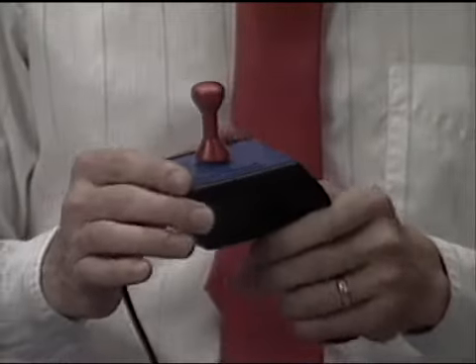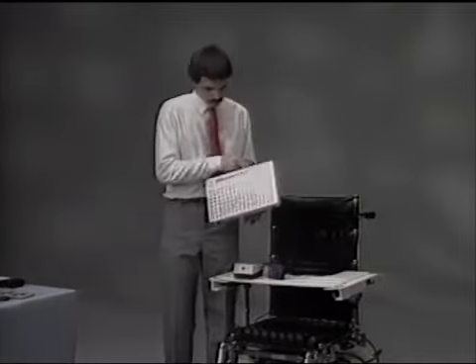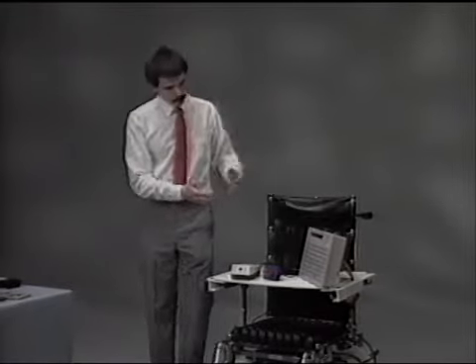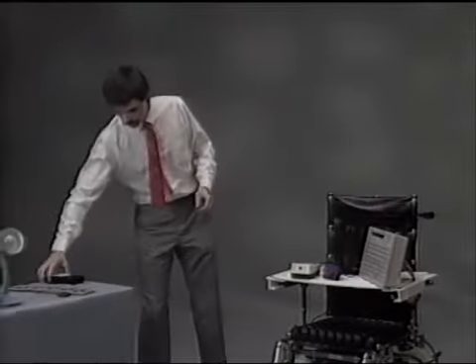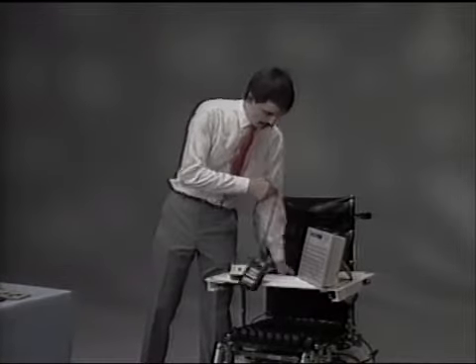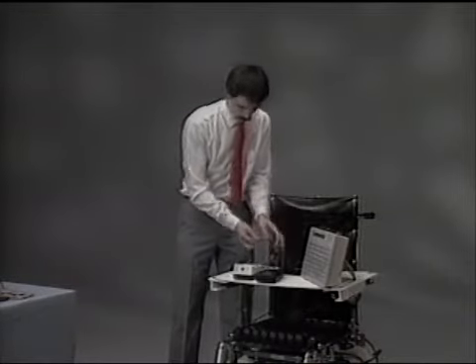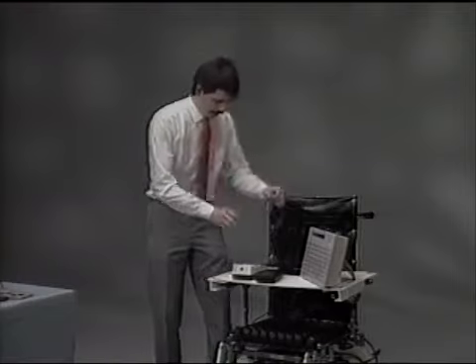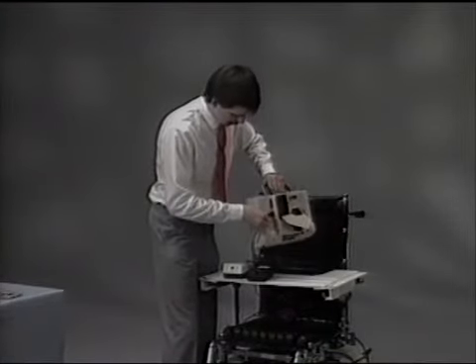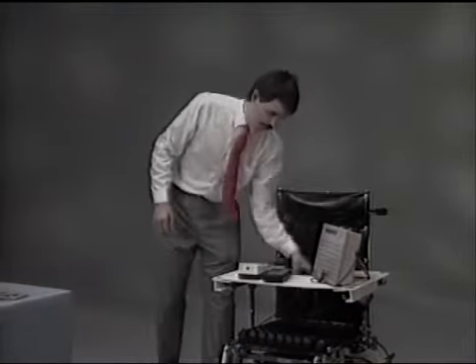We run into the problem of using this same joystick when we operate our communication aid, as we just demonstrated. And here's our communication aid set up to operate with a joystick. Now we look at a way of interfacing the two. There's a very inexpensive item that can be plugged into both our power wheelchair and our communication aid. We plug it into the power wheelchair first, and then we'll plug the other end into our communication aid. This allows us to communicate and also use our power wheelchair with the same joystick.